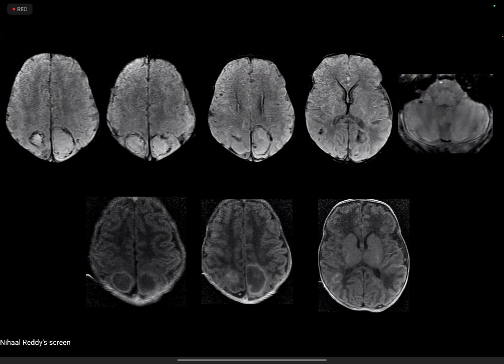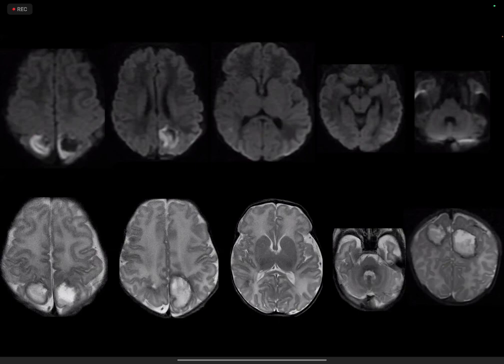No, all hematomas in the subacute stage should show uniform diffusion restriction. Here only the periphery is showing diffusion restriction, and that too irregular. So if it is bright on T2, I don't know about T1, then that is relatively uniformly hyperintense. But the whole thing is not showing any diffusion restriction, if it were a hematoma in the subacute phase, which can show diffusion restriction.